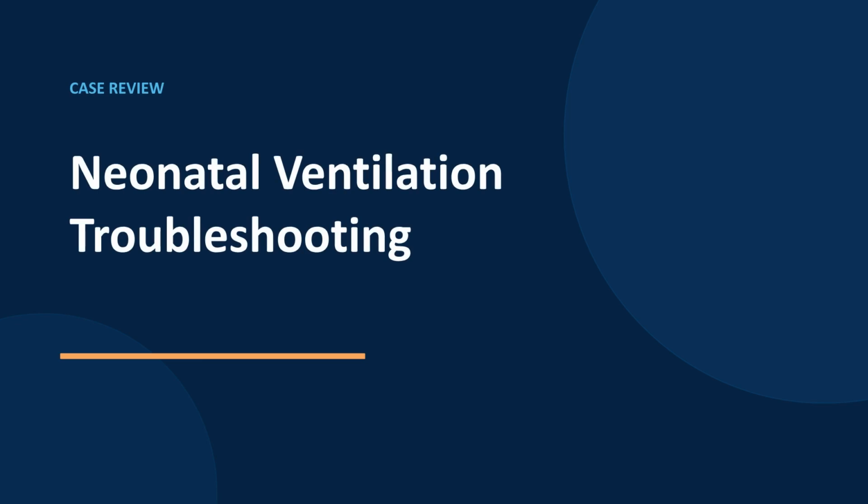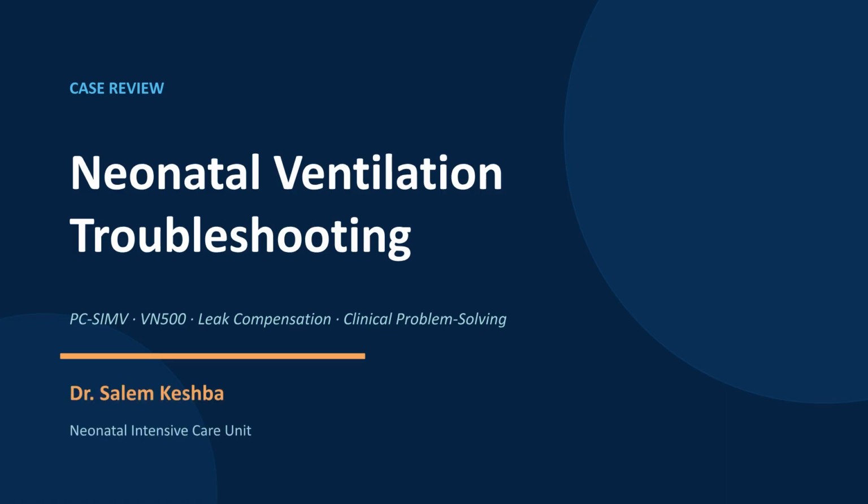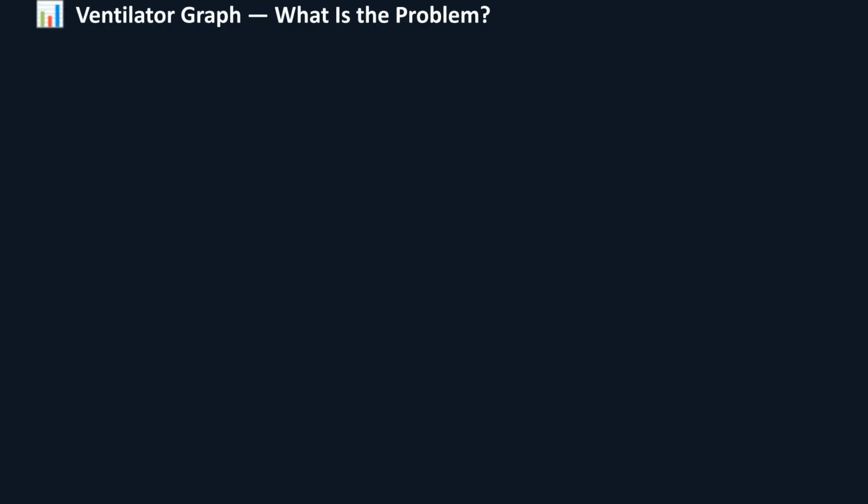Welcome to this case review on neonatal ventilation troubleshooting. We will cover key concepts like PCSIMV, the VN500, leak compensation, and clinical problem solving. I'm Dr. Salem from the Neonatal Intensive Care Unit. Let's review this ventilator graph.